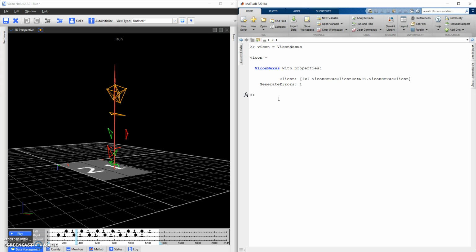Okay, so the connection will not work, and further processing will not work, unless you have an internet connection. It seems to depend on an internet connection for these 2 packages to link up. And secondly, it might not be working if you have not typed in the first statement exactly as you see it. So those might be 2 reasons why you're having problems, but for the most part this should work quite smoothly if you're connected to the internet.